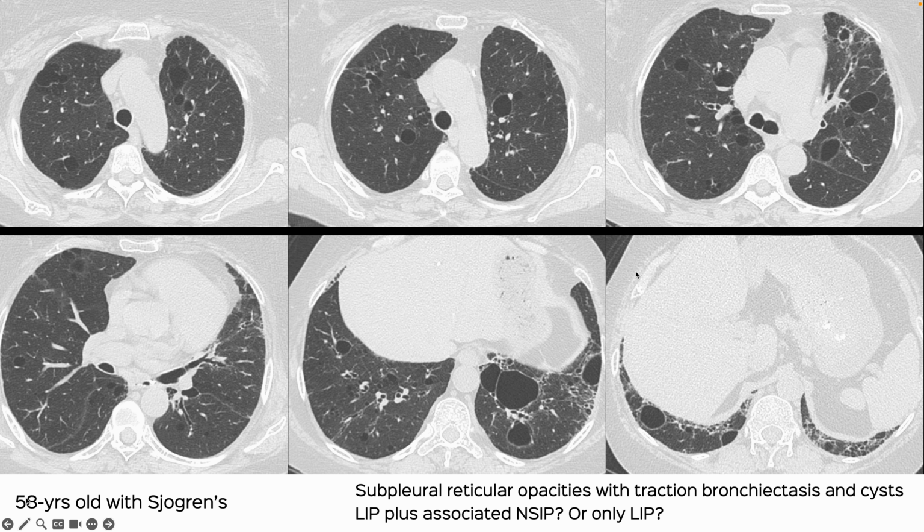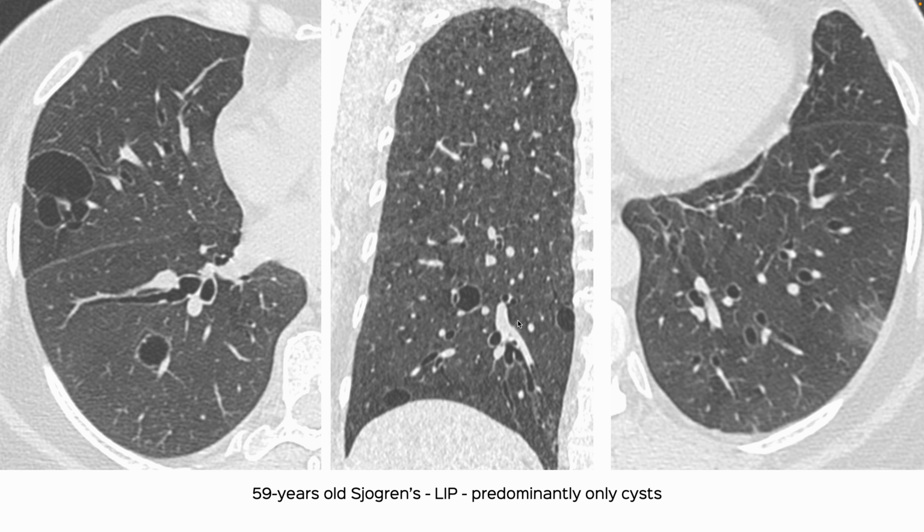But we get overlap patterns, we get mixed NSIP OP, we get mixed UIP OP, and I suspect sometimes you also have a mixed NSIP UIP pattern. Is this just LIP, or is this a mixed LIP NSIP pattern? We don't know, but I would at least say that this patient has LIP.